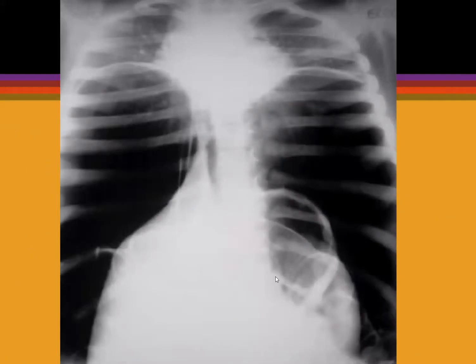So this is a shocking X-ray. What do we think is going on? It almost looks like a chest X-ray, doesn't it, with the heart and the lungs? But it's not. The heart and the lungs are up here. So that's the mediastinum. This is the lung.